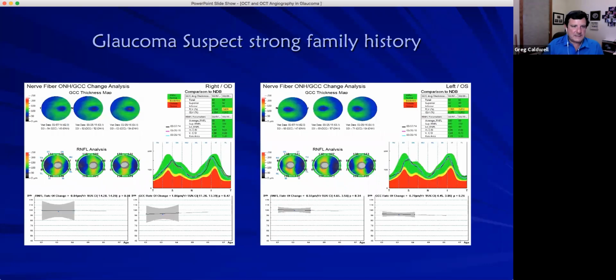And this is always nice. You can see, glaucoma suspect. We're following him over time. Good symmetry going on here. What we call a good TSNIT: temporal, superior, nasal, inferior, temporal. Getting that up-down appearance because that nerve fiber layer is piling up superior and inferiorly, specifically superior temporally and inferior temporally. So following this patient over time, we see they're not progressing, with this strong family history.